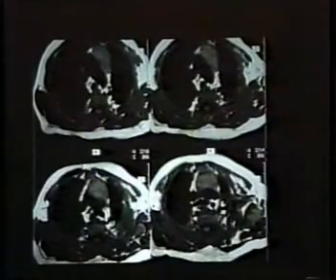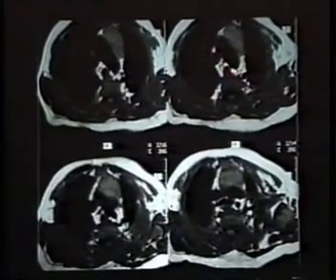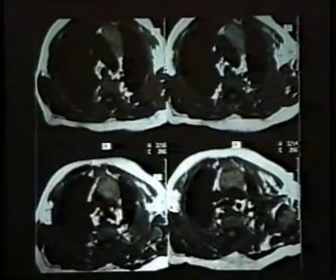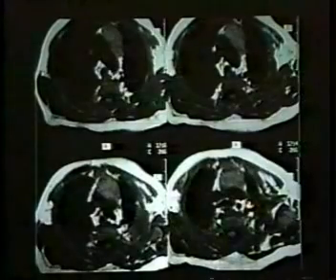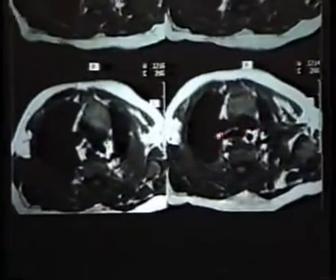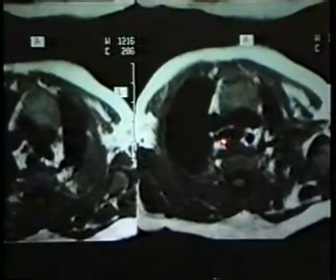At MR, the undersurface of the aortic arch, the trachea. Middle aortic arch, trachea, SVC. Top surface of the aortic arch, already showing some tracheal narrowing, and as the innominate swings anteriorly, complete obliteration of the trachea. In the sagittal projection, which we've now had a chance to do in several patients, you are looking from right to left, 3mm images.